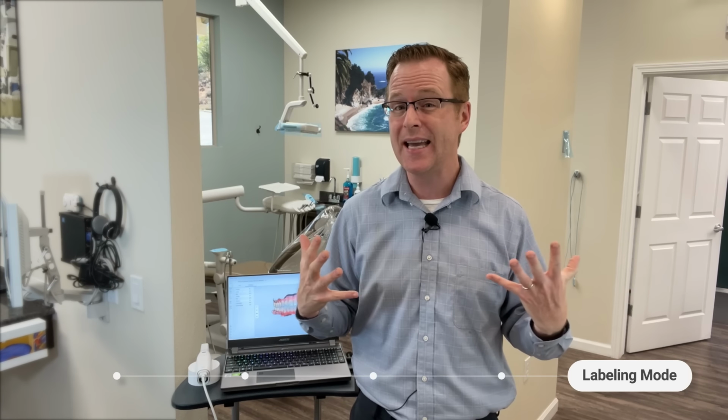The model builder function allows us to either engrave or emboss a text-like function on the side of a model. So if we wanted to make a model that has identifying marks, maybe the patient's name or the start date of the models or the actual scan dates, if you're doing this as part of an aligner-based treatment and tracking the patient over time, we can either engrave or emboss the patient's name and the identifiers on the model, allowing us to print multiple models based in the model builder function.